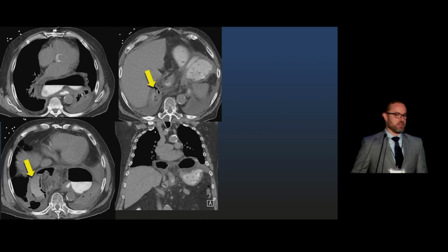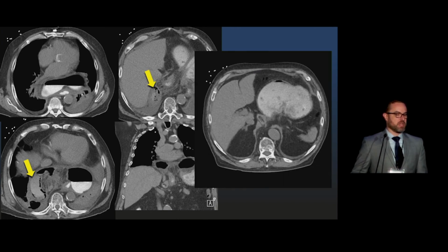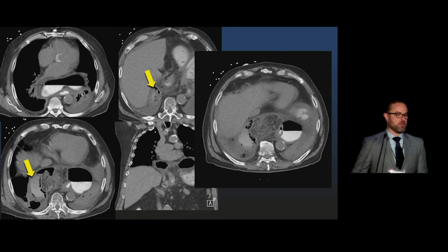In addition to identifying ischemia, we also want to note patients who have evidence of perforation. This is a patient with an intrathoracic stomach. We've given oral contrast here. There's a large gas, fluid, and contrast collection in the right pleural space, and so this patient has gone on to perforation due to their gastric volvulus that undoubtedly resulted from ischemia.